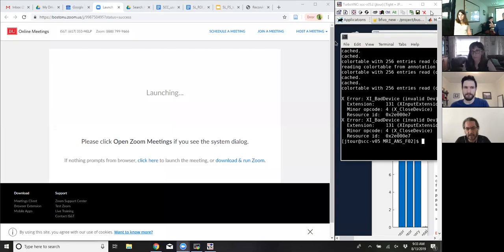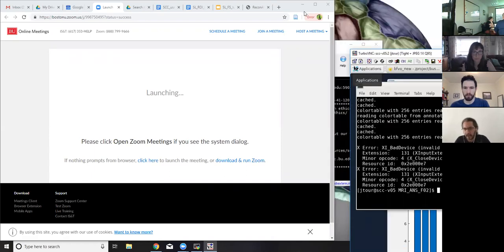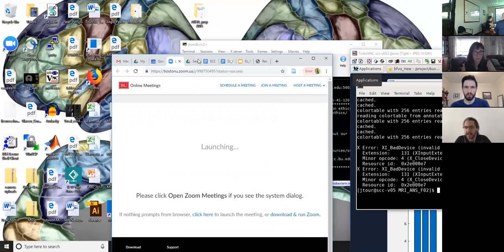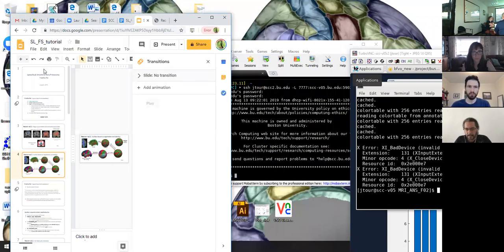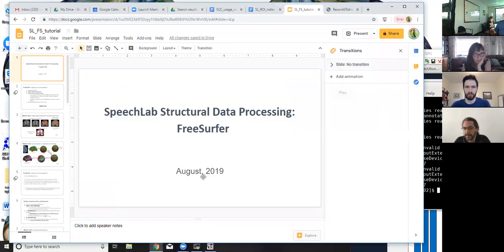to look at the number of supra-threshold clusters, and you want to count the number of voxels in these clusters that are in the left hemisphere versus the right hemisphere, right? Yeah, and when I do the voxel-wise analysis, that's easy to do, right? Because I can find the clusters, then export a mask, and then just set everything to one and count it. But I was wondering if I could do it with the ROI analysis.